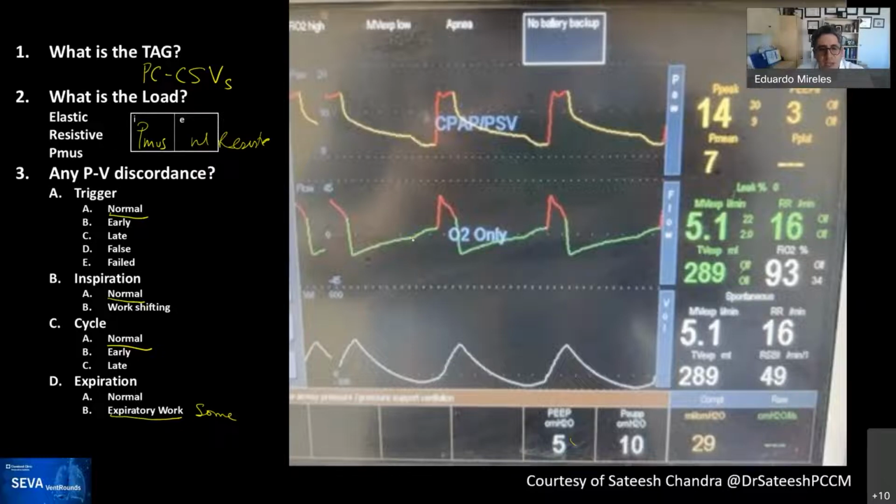But anyway, if the patient does inspiratory effort, what will happen to the flow? It would move up or down? Oh yeah, you're right. I guess that would be inspiratory effort. The flow would go up. And then the pressure would go down. Pressure would go down, yeah. So if the inspiratory effort started over here, right here. I see. So that would be basically that the patient is trying to start the inspiration, but doesn't.